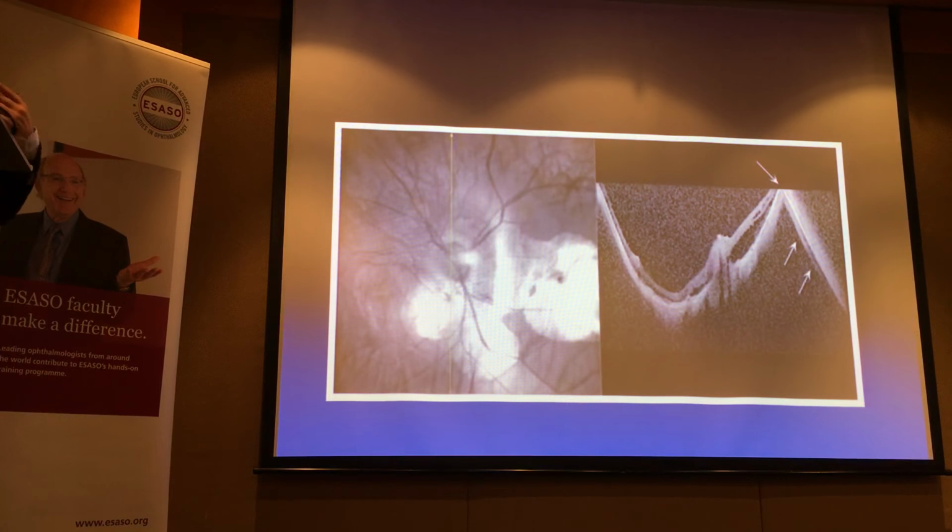But be very careful when you see something like this, and obviously you must know when to steer this. One little tip on this: this one's actually going through this, but let's assume the fovea is still at the center here, going through the macula. If you wanted to concentrate on this, you know, this is high myopia. One thing you can do is to narrow the scan, because when you have a wider scan, it takes the entire curvature into account.